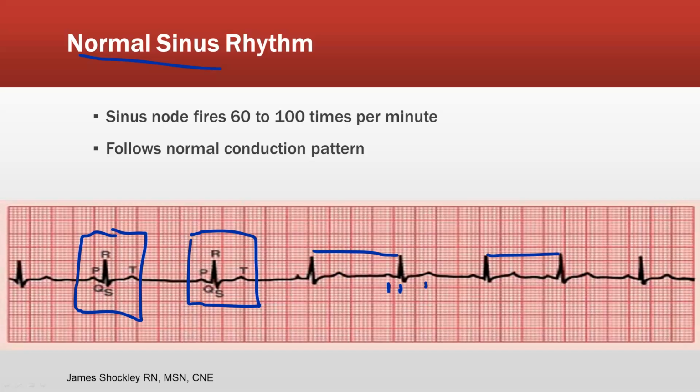There's something out there called a sinus arrhythmia, which just basically happens because as we breathe, talk, move, our heart rate can change, and that's going to affect that distance just a little bit, because remember we said we care only about left to right. We don't care about up or down, and then we see everything left to right is pretty consistent.